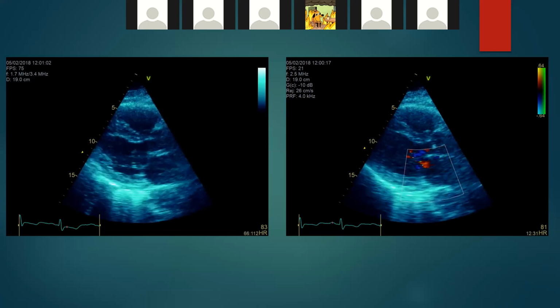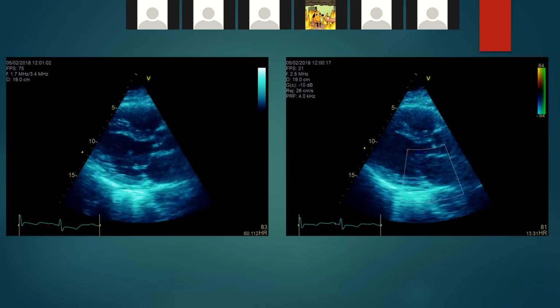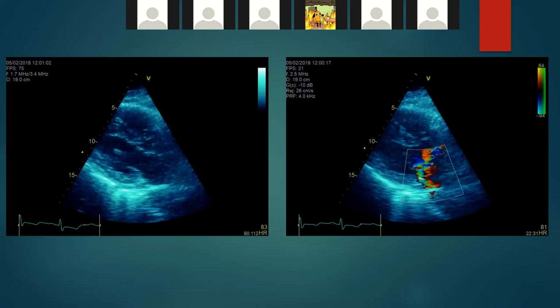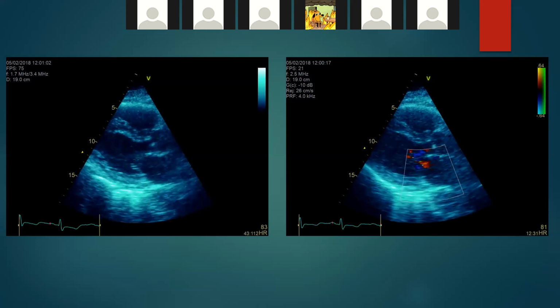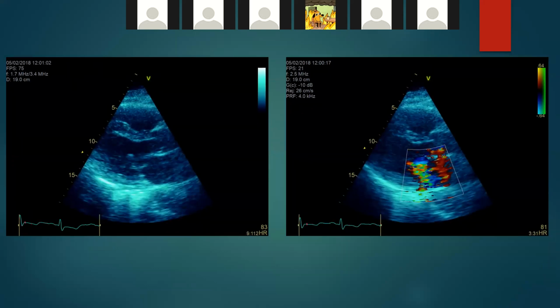And Jamal, do you want to remind us again about the scallops? So I'm always a little wary about this, but I guess the teaching is if this is long axis, it's A2P2. Yeah, fantastic. Thank you.